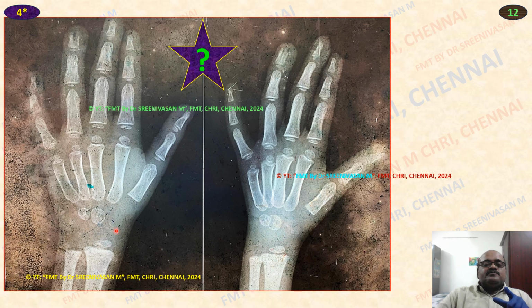In this X-ray, 2 carpal bones, lower end of radius is well developed, formed, but heads of 2nd, 3rd, 4th and 5th metacarpals have formed. No carpal bones except these 2 are there. So as far as this is concerned, these heads appear at more than 1.5 years, right? The base of the first metacarpal is not seen, less than 3 years. Lower end of radius appeared more than 2 years. Base of first metacarpal not appeared, less than 3 years. So what is the age?